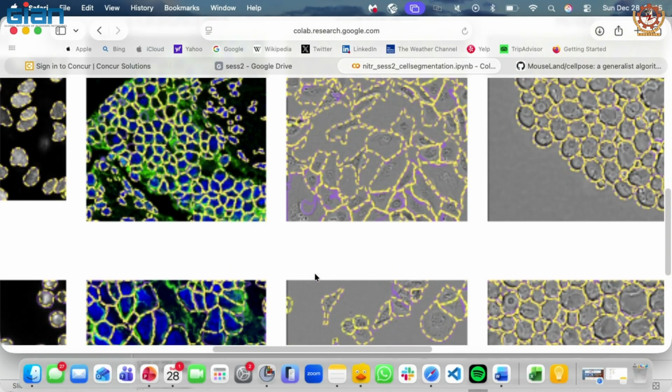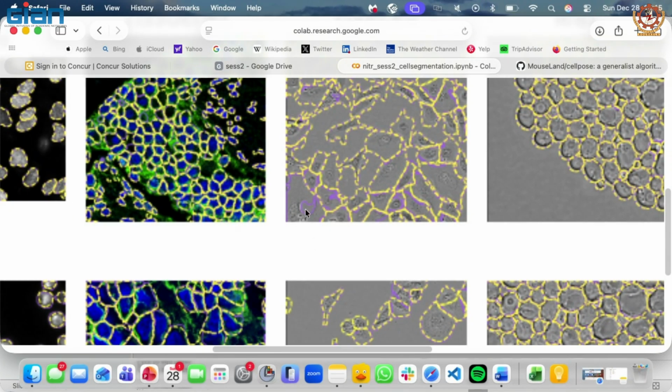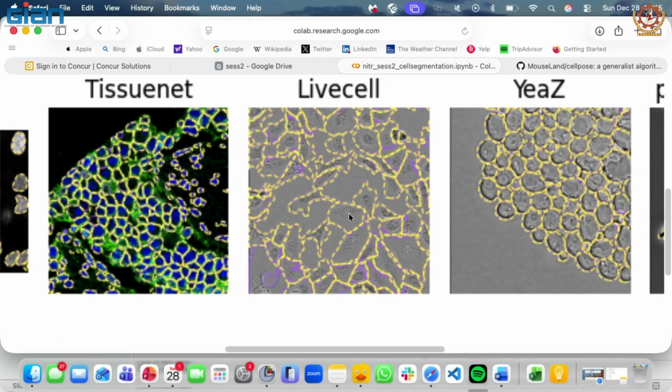Although, just a quick glance, this ground truth is in purple. So you see there are some errors here and there. This purple is the ground truth. So it has missed this thing entirely, it has missed some section here entirely, etc.